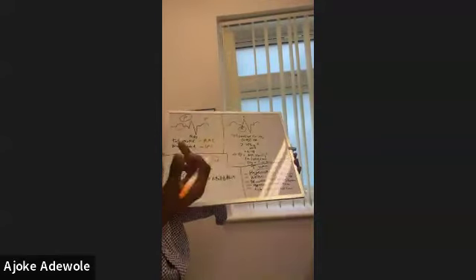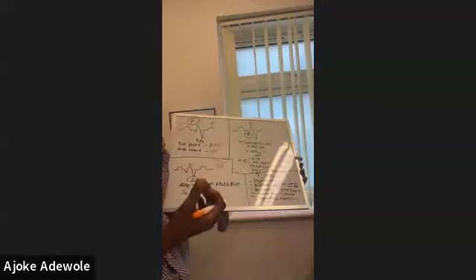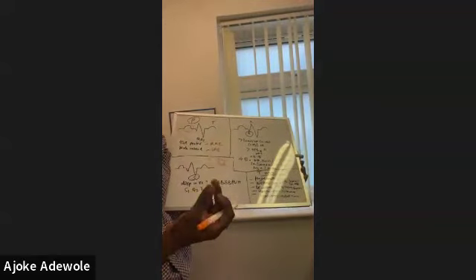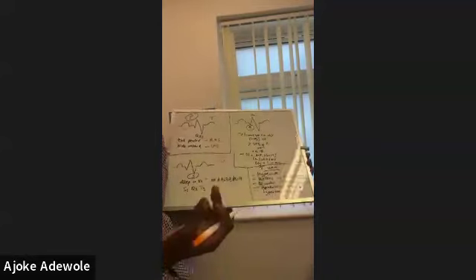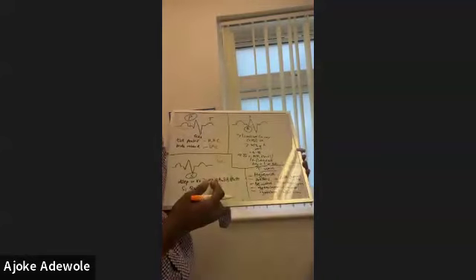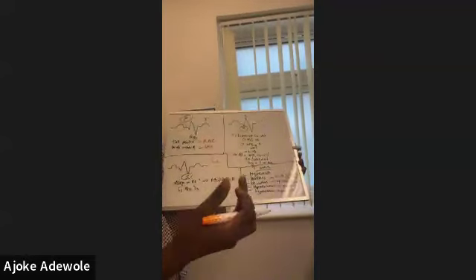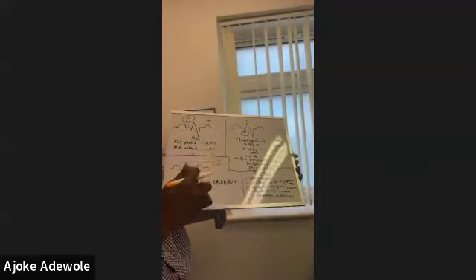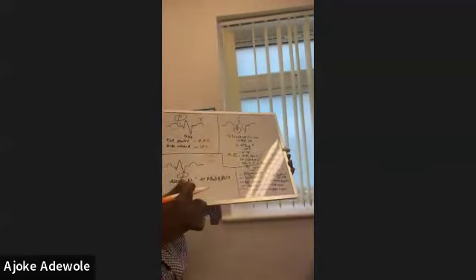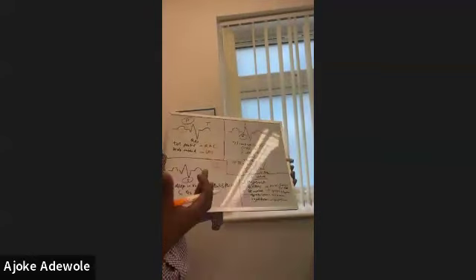So a problem with the S wave is that it could become deep. You could be talking about an LVH. We talk about S in V1, R in V6 for LVH. If S is deep in V6, it could be an RVH. Then we talk about the right bundle branch block, we talk about the RSR pattern. These are other lectures, but don't get overwhelmed. Just know that the problems with the S waves becoming a bit too deep, either in V1 or V6, could mean that hypertrophy of some sort is going on.